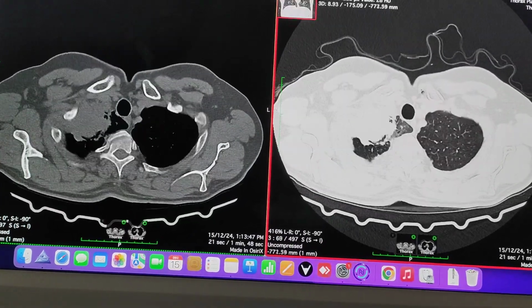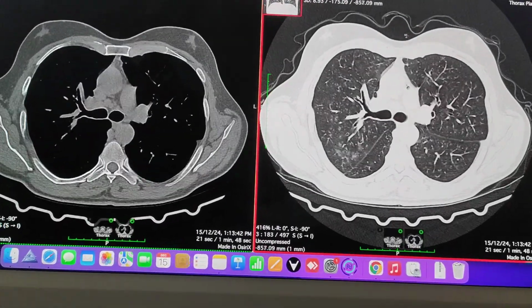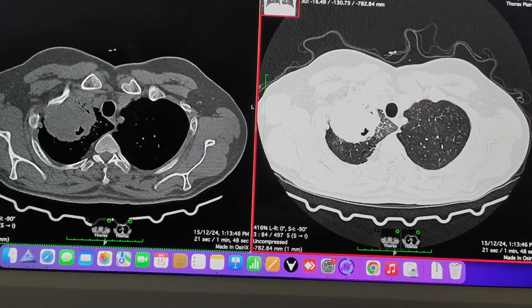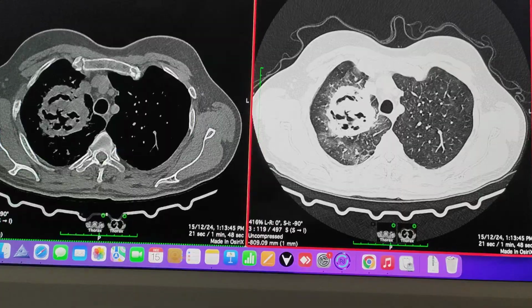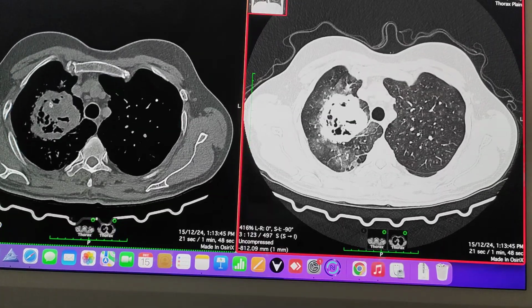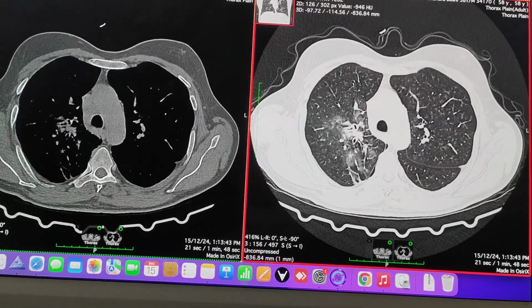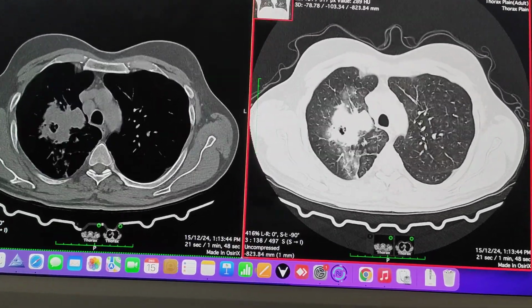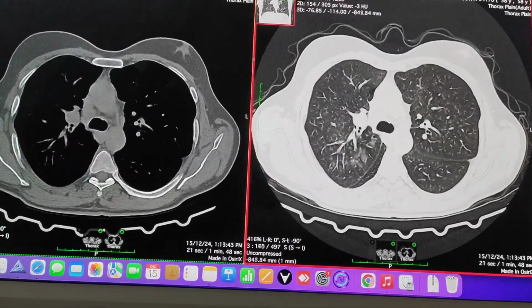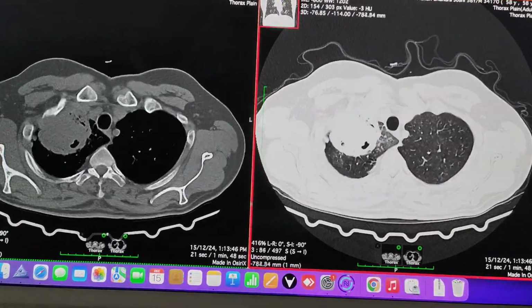With a history of cough and sputum, with right side weakness in the body, and the patient age is 58 years, male. Here we can see in the apical segment of right upper lobe there is a cavitatory lesion with internal septa within the cavitatory lesion, and surrounding ground glass opacification, consolidation and ground glass opacification, likely corresponding towards the bird nest appearance of mucormycosis.